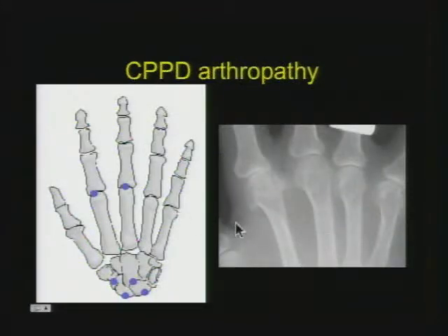One of my favorite arthropathies is CPPD crystal deposition disease, or we do say chondrocalcinosis, but that doesn't really describe the arthropathy. And we talked about radiocarpal involvement, as well as MCP in particular, especially the second and third, and occasionally the PIPs and DIPs. Now, there are some very classic appearances that we want to know, including the drooping osteophyte, which is on the radial aspect of the metacarpal head, usually the second or third, where you have the narrowing. And it could just be from CPPD crystal deposition disease.